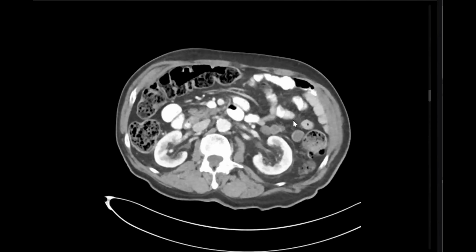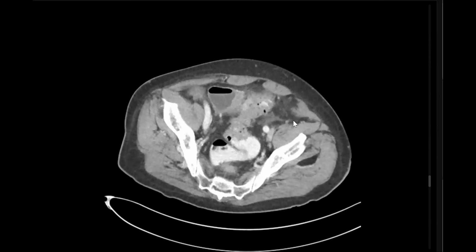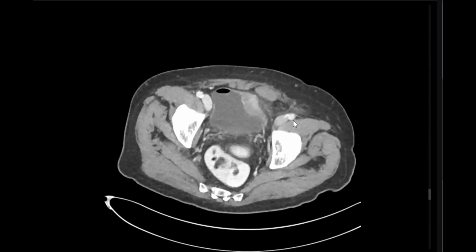So my final diagnosis here would be acute diverticulitis complicated by a fistulous tract between the sigmoid colon and the bladder, a colovesical fistula. Very good. For surgical and urological referral to determine the management. Excellent, my friend. Thank you, sir.